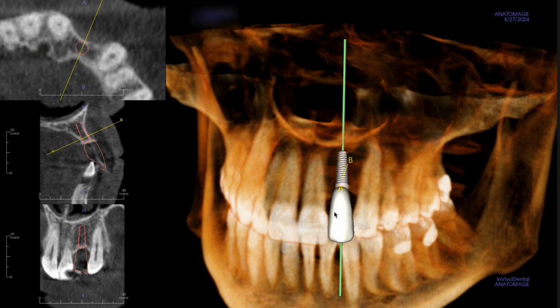If we do that, we have to identify two things. One is there's a vertical deficiency, which means that the future tooth might be longer than what nature had intended that tooth to have if there was ample soft tissue and hard tissue. But there's also a horizontal defect too. So we have this rather significant buccal concavity here.